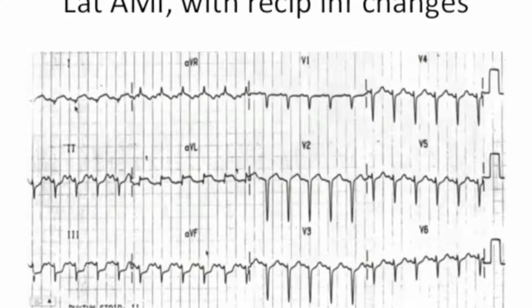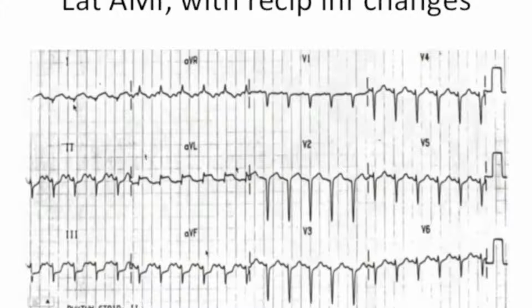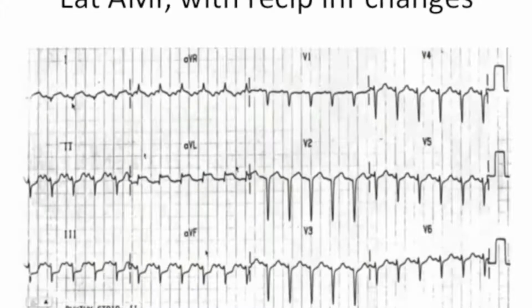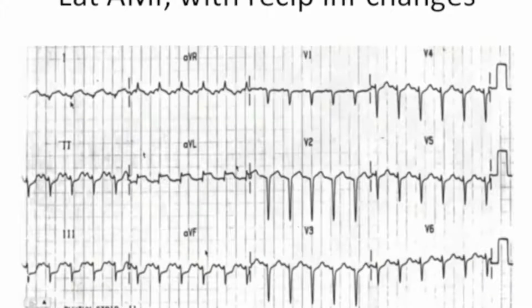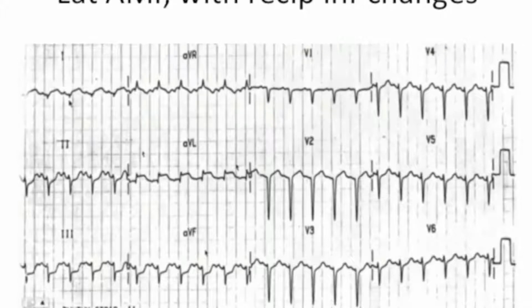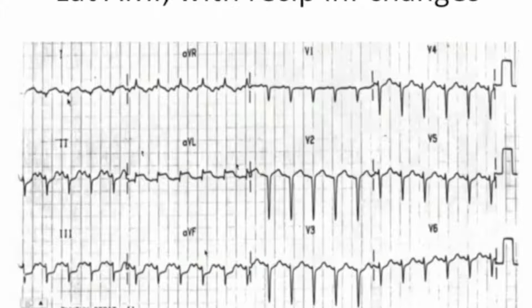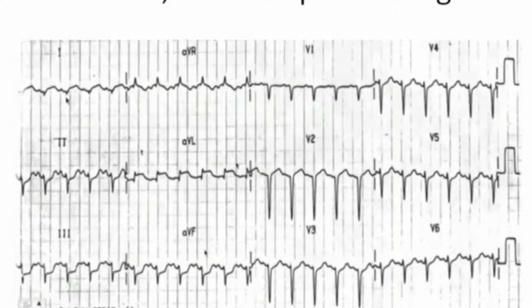So let's look at another ECG here, and if we look at the rate, it's going to be 300, 150, maybe 160, 170 there. Are there P waves? Yes, there are. And I think they're inverted in AVR and upright in 2, so it's sinus rhythm. Let's look at the QRS morphology. The QRS is not very wide. It's less than 3 small boxes. There's no slurring upstroke. And let's look at ST changes for ischemia.